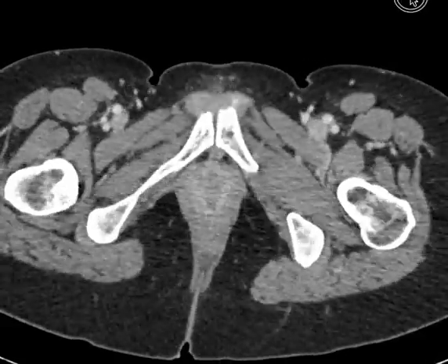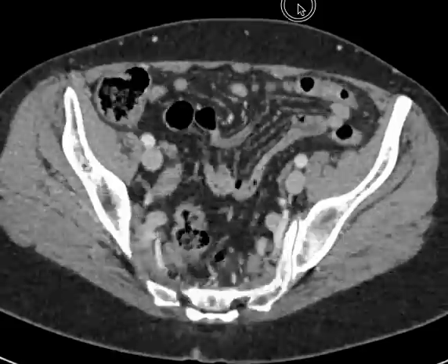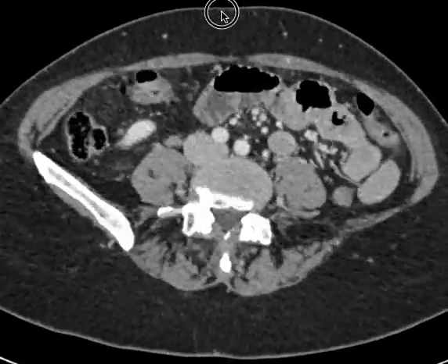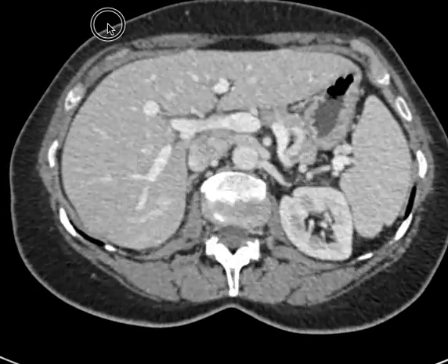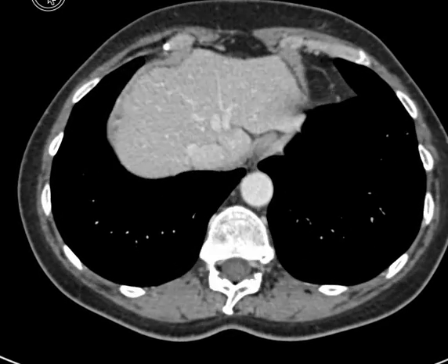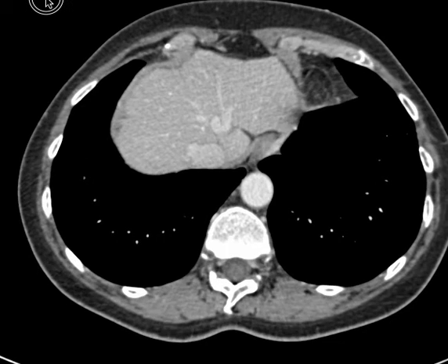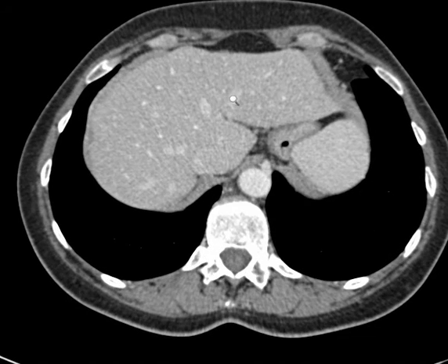And so we just head back superiorly just to give you a look at things again after you've seen all these loops of bowel. A couple of parts of things that are considered part of the gastrointestinal system that we didn't really talk about so much is the liver. So again, here's the liver. Looking at this here, a lot of the anatomy in the liver is in its blood vessels. So here you'll see the inferior vena cava, some of the hepatic veins that bring blood back to the inferior vena cava. So here's left hepatic vein, middle hepatic vein, right hepatic vein.